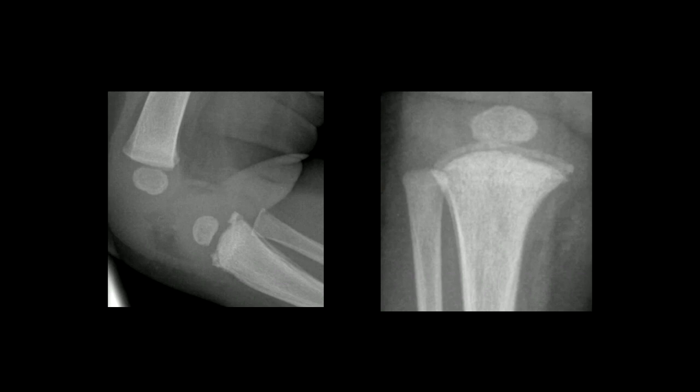You may know these as corner fractures or bucket handle fractures. These are just additional names for these CML lesions, but they are all the same fracture. Here we have an example of corner fractures of the proximal tibia and a bucket handle fracture of the proximal tibia when it's viewed with slight obliquity.